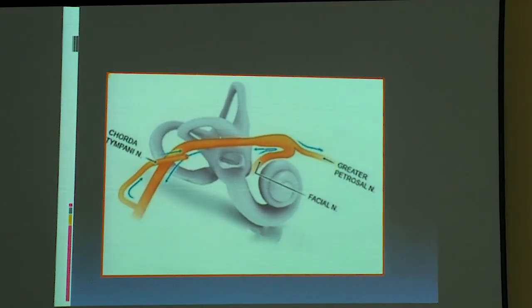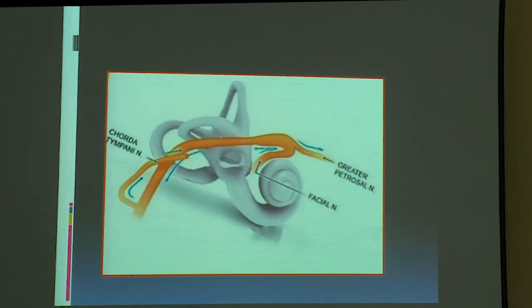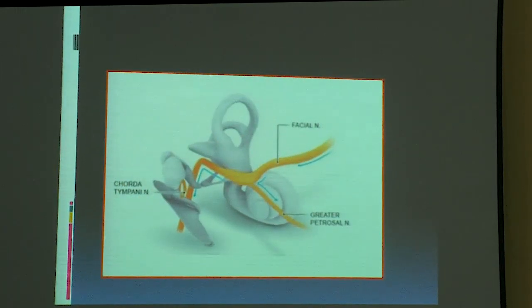We have to realize that if we have to understand CT scan of the temporal bone, it has to be all in relation to the course of the facial nerve. You have to follow the facial nerve accurately as it is coming from the pontomedullary junction. You cannot see it on CT scan obviously. From the cisternal segment to the canalicular segment, labyrinthine, tympanic, and back again, and this is in relation to the vestibule. The evaluation of the facial nerve and the vestibule are 2 things which you have to understand.